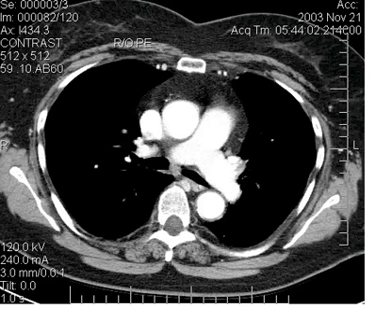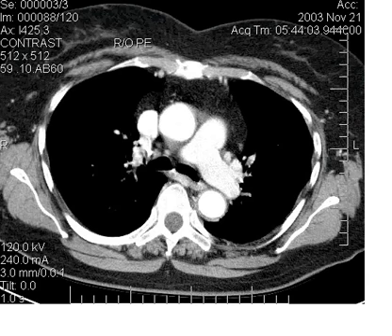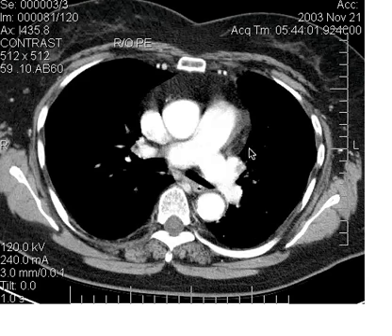Let's go down a little bit lower. Okay, if you follow it up, you'll see it extending here into a left upper lobe pulmonary artery branch. So it's hard to make any of these diagnoses on one image. So most of the time you have to kind of go back and forth and go, aha, yeah, this little thing here, which could be just a nothing, like it is over here, here it's just a cut through the edge of the vessel, is this real.